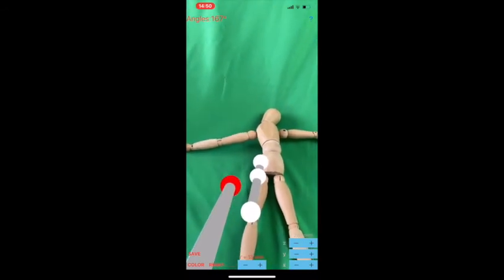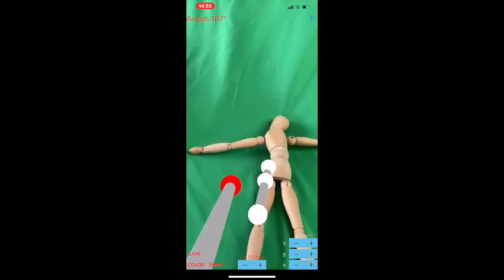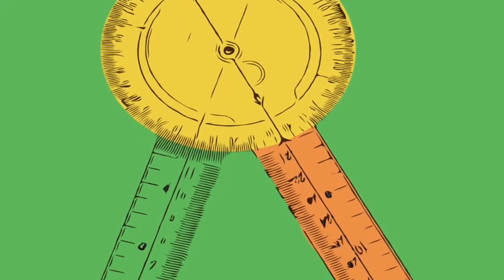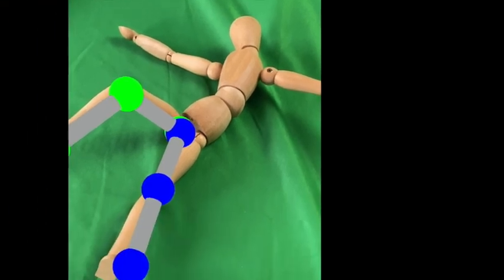The spheres can be changed in size, R, adjusted by pressing the minus or plus button accordingly, or in color, for better handling of the points and helping the physician differentiate between 2 different measurements, flexion and extension, or external rotation versus internal. Save the measured values and results as a screenshot to the photo roll for later review or consultation.